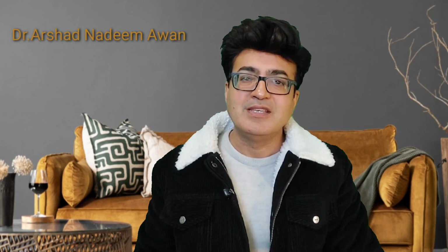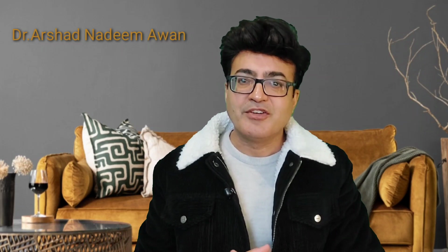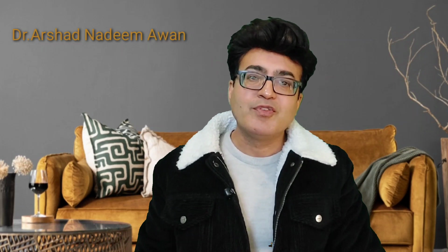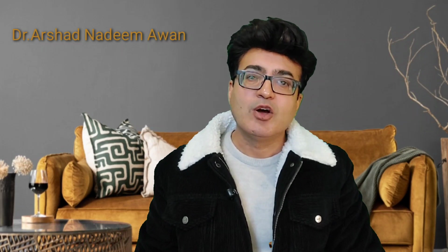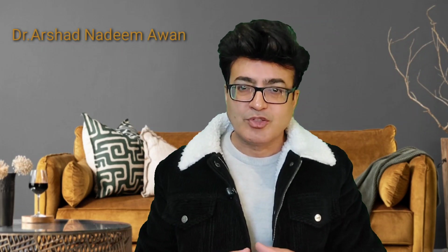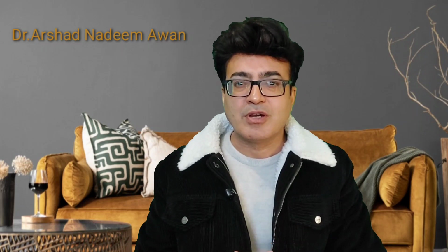As you all know, these days I'm discussing musculoskeletal tumors, especially on conventional radiograph and CT scan images. Today my topic of discussion is osteoblastoma. Osteoblastoma is a benign tumor producing osteoid and woven bone. Histologically, it is similar to osteoid osteoma. In other words, it can be called the big brother of osteoid osteoma.